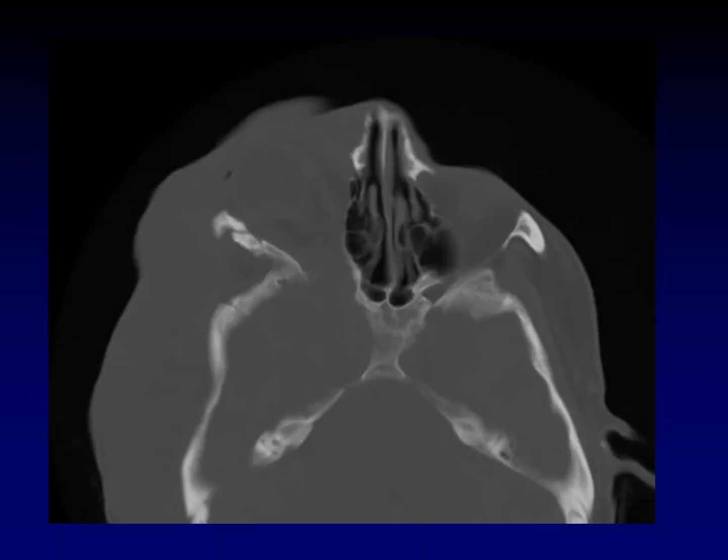Remember that patients with neurofibromatosis type 1 will also get a characteristic dysplasia of the sphenoid bone shown here, as well as a large overlying plexiform neurofibroma in this case.